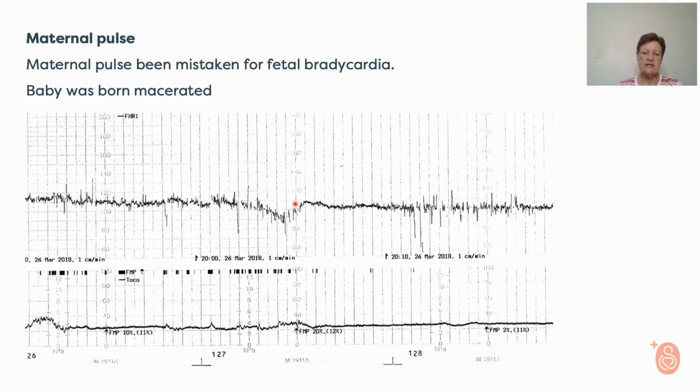And when a cesarean section was done on this mother, the baby was born macerated. So it's very clear that it was the maternal pulse that had been monitored here. And that is just, again, a big warning to not confuse the maternal pulse with the fetal pulse.